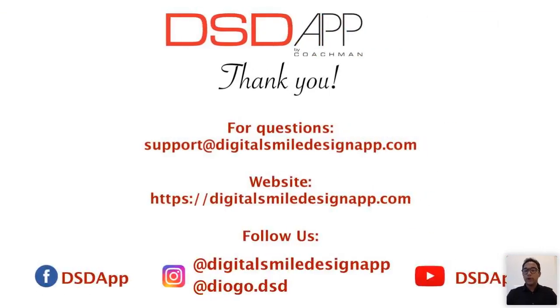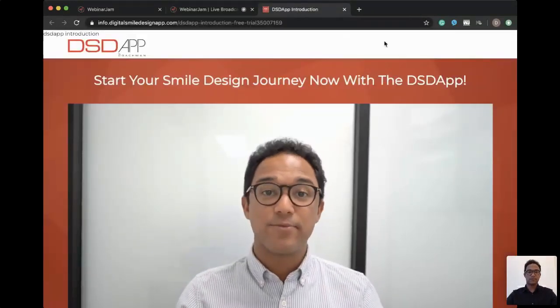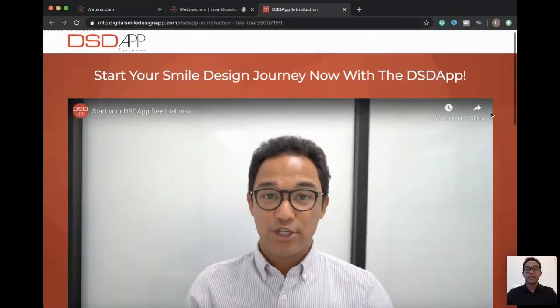So let me show you how you can get access to our 30 days free trial. It's quite simple. So let me share my screen. Here you get into our 30 days free trial.